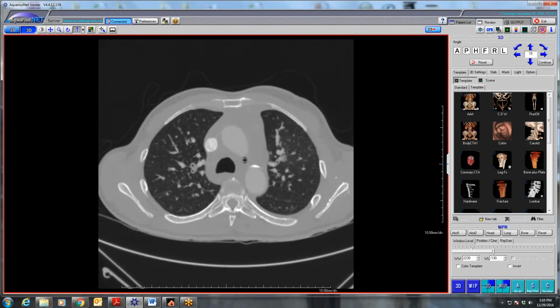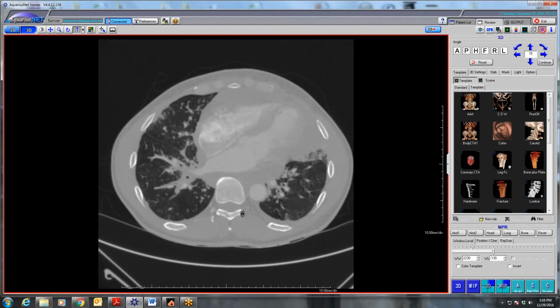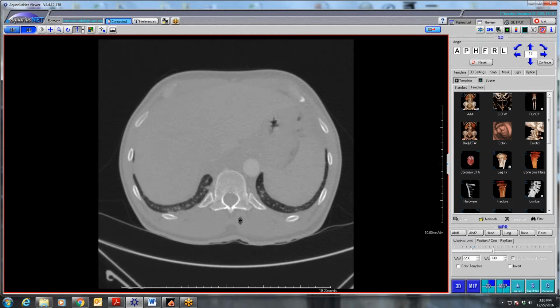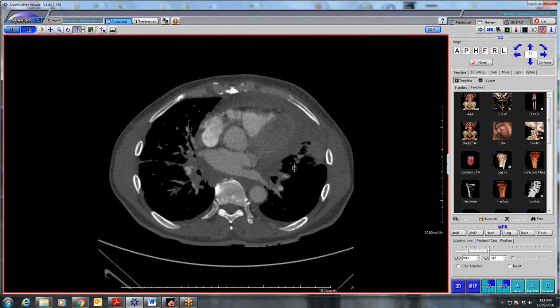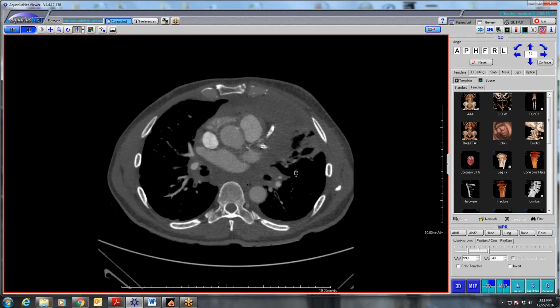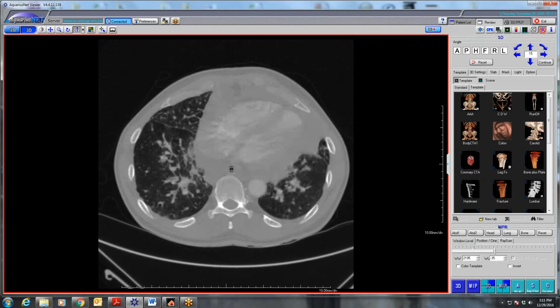And we are assuming, based on another case we have that looks similar, and also just from similar appearances that we've seen in texts and the rare cases, that this is a case of congenital lymphangiomatosis, or I can never remember. Jeff, do any of you guys remember the exact name? You just get this large kind of infiltrative lymphatic malformation. You get lymphatic malformations through the lungs.